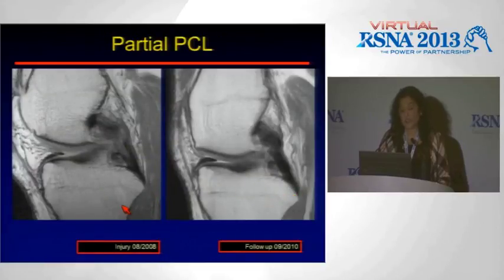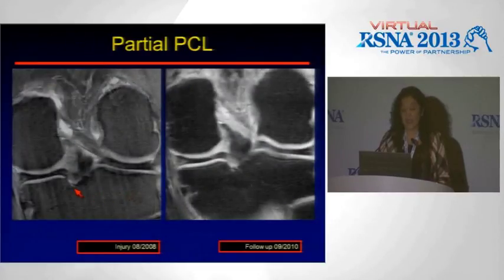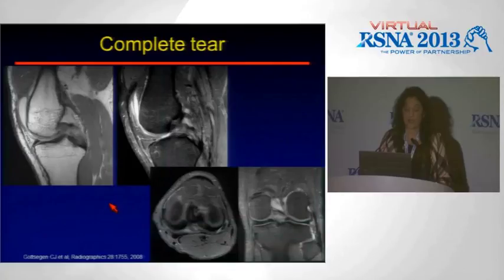So as you look at this patient, this is at the time of injury, there was a partial tear. These bundle injuries can look confusing if all you rely on is your sagittal images. And as you look at the coronals, we can see that the medial fibers are abnormal. Notice that they have returned to a normal appearance on this follow-up, and the patient treated conservatively, whereas the more anterolateral fibers are preserved. So you can get single bundle injuries. Again, these patients are typically managed conservatively, and it accounts for a confusing looking appearance on your sagittal sequences.